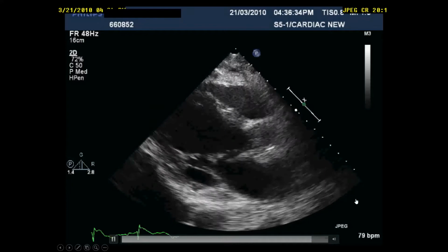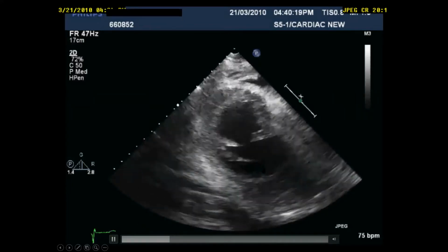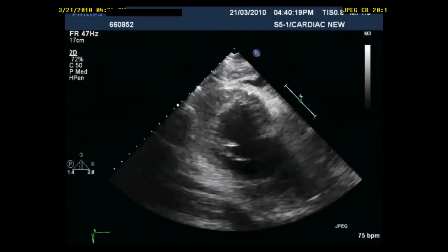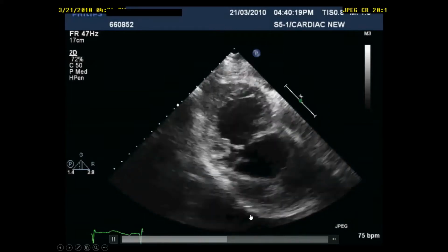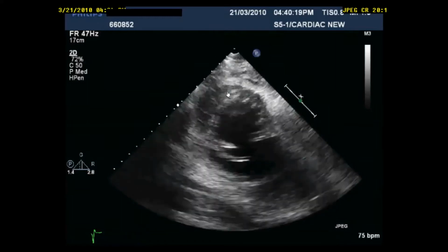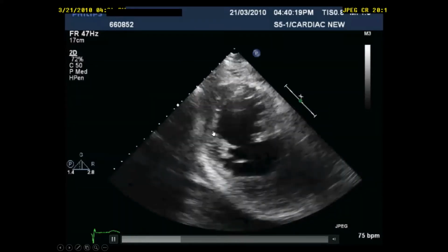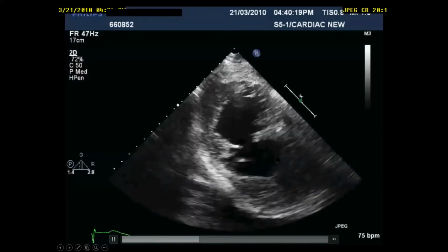Okay. Now, this is again akinetic posterior wall, but with additional abnormality, which is... Aneurysmal also. Exactly, and this aneurysmal posterior wall might even be ruptured, might even be a false aneurysm. That's why we gave contrast to this patient to make sure that this wall is not ruptured, because you see the geometry is supposed to be a circle and a donut, but the posterior wall is bulging so much outside.